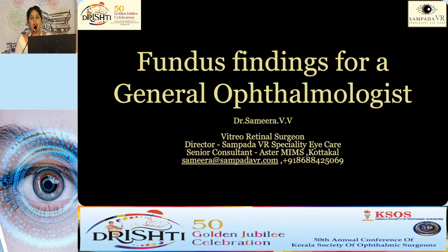Good morning, everyone. Fundus findings for the general ophthalmologist. It's a very vast topic. I don't know how I am going to do justice by giving an 8-minute talk. All right, so I'll be just brushing through the common things which we are going to see in our normal practice.